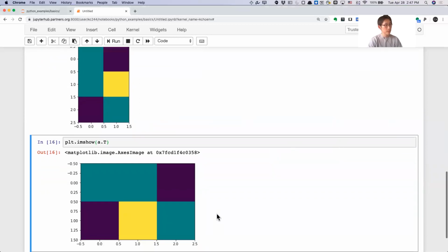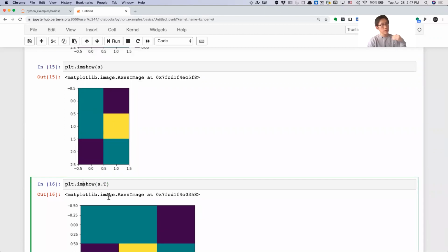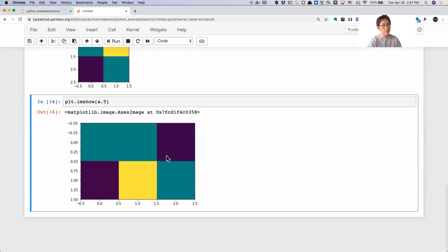All right. The sizes look a little bit different, but ignore that at the moment because we are using the simplest form of plotting, so they are not controlling for the size. So let's ignore them. Okay.